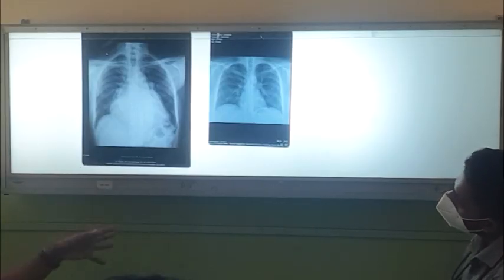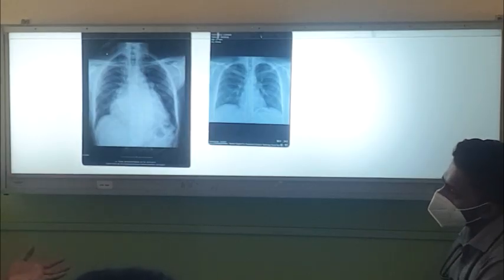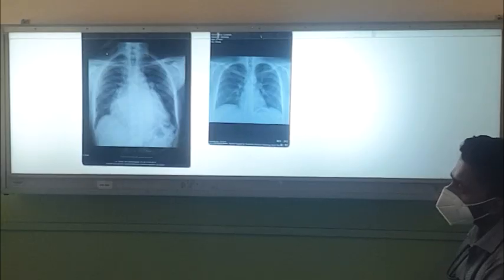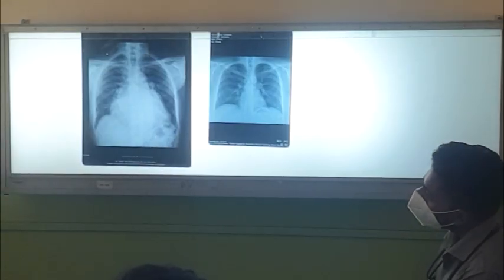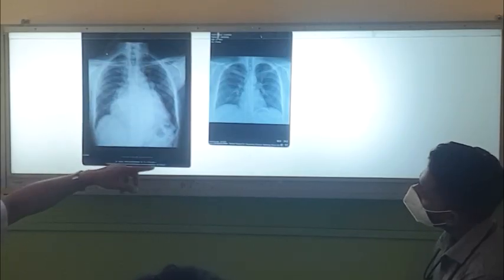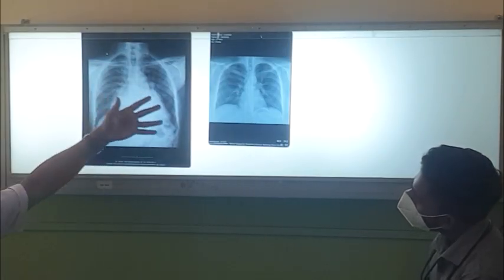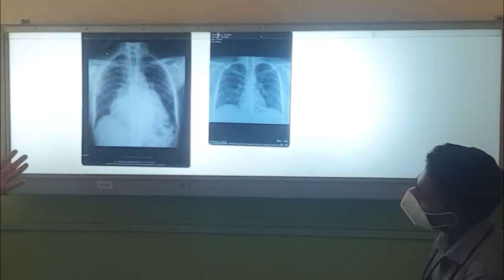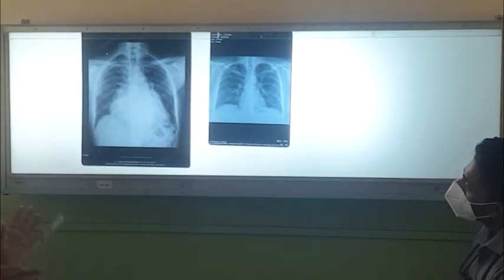When there is severe mitral stenosis, the left atrium gets hypertrophied and dilated, trying to push blood into the left ventricle, and the left ventricle is actually all right here. So this is a dilated left atrium, and then you get congestive cardiac failure, pulmonary hypertension, upward diversion, pulmonary edema, and right-sided failure also, right ventricular enlargement and right atrial enlargement later on.